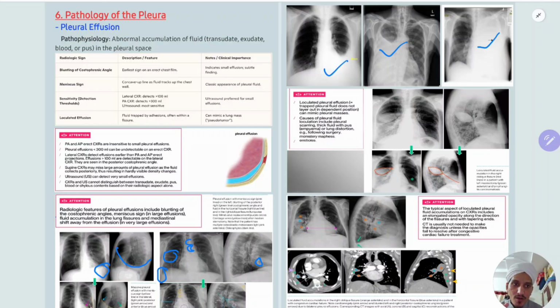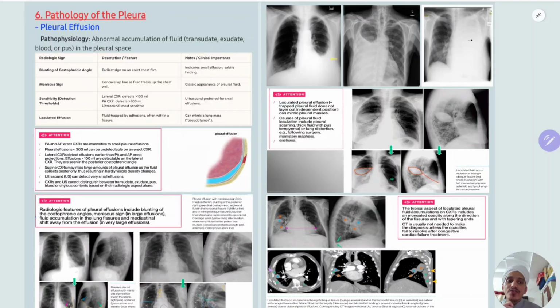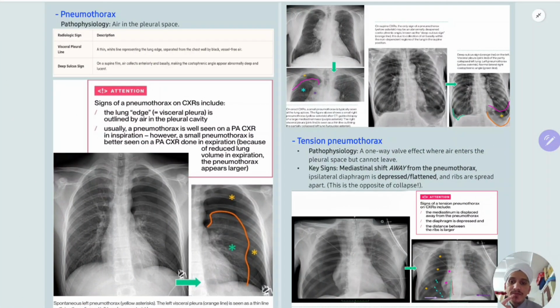So this is the oblique fissure, you are able to make out loculated effusion accumulation in the oblique fissure, with the left mastectomy, the left breast removed because of carcinoma. So this is cardiomegaly, and there is accumulation in the horizontal and oblique fissures both, and because there is cardiomegaly, likely it is cardiogenic pulmonary edema. Okay, that's about pleural effusion, all about pleural effusion.